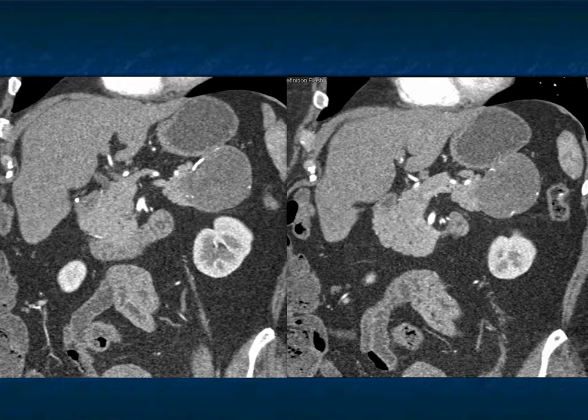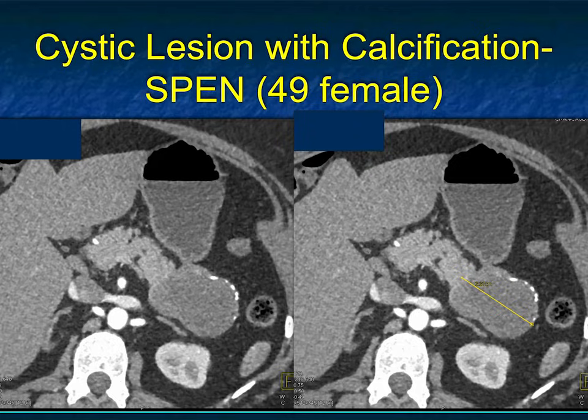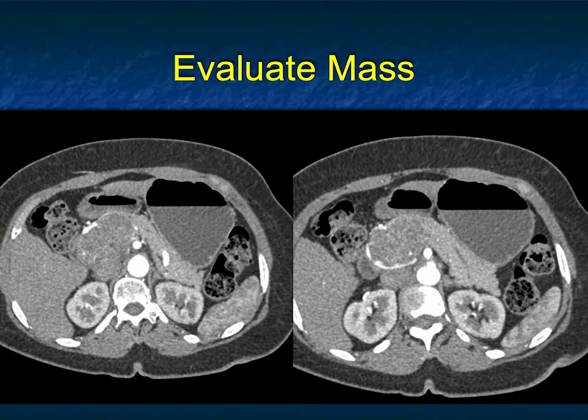And what did this end up being? This ended up being a SPEN tumor. Again, it's important to work through the process, the findings, the ducts, the presence of calcification when you analyze pancreatic lesions. And you can see I'm not showing you adenocarcinoma. I'm showing you more the spectrum of what we can expect to see with pancreatic lesions.